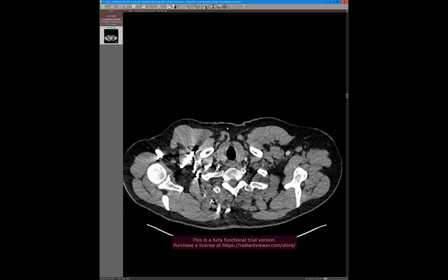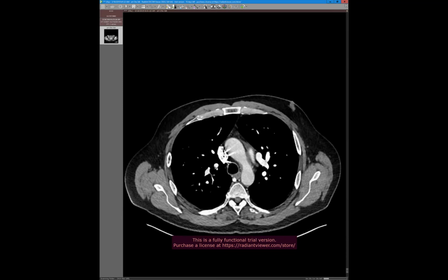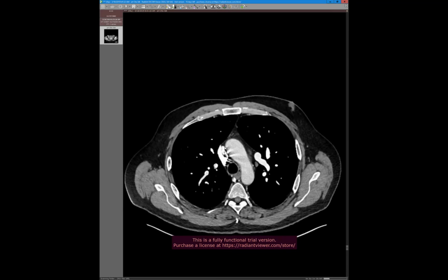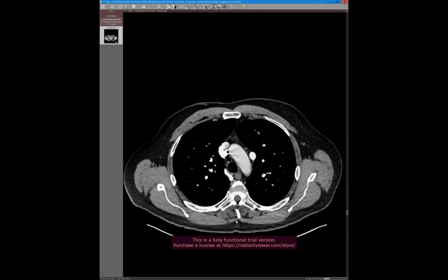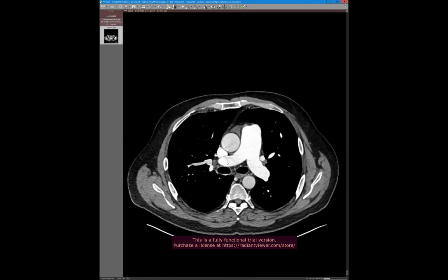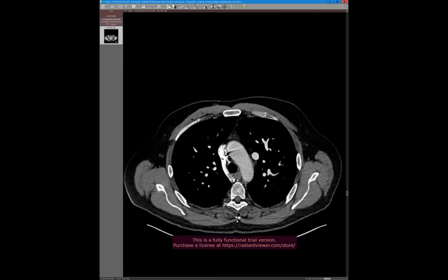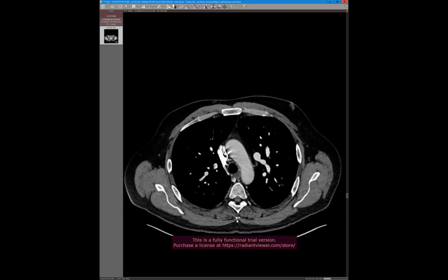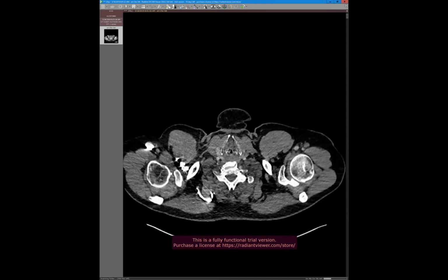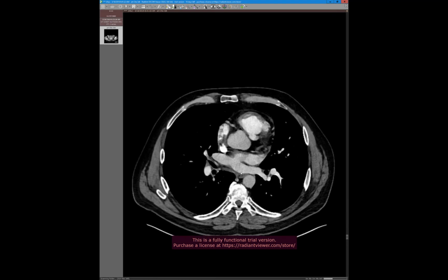So this is a guy who presented for CTEPH workup, and he's CTEPH-y, but he's also got, you can see this PAPVR. So the question was, and he has some findings of pulmonary hypertension, and I'm sorry, it's taking a while to load. And he definitely has, you can see areas that he clearly has CTED or CTEPH. But the interesting thing here, if this thing is really taking its time, I apologize about that.